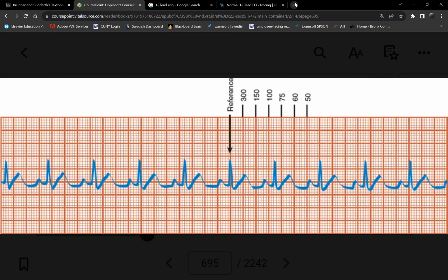All of these methods, by the way, are estimates. It can't be accurate, because the only accurate heart rate is if you do a 1 minute strip. Then yes, that's accurate, because you literally counted a full minute strip. But again, it's not practical. You won't have time for anything else. You're going to be busy. So we're not using a 1 minute strip. We only use 6 seconds.